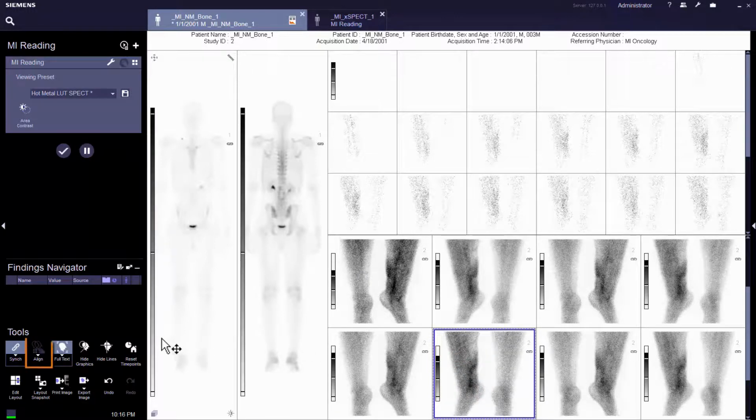The lock and scroll icons are used to adjust spatial alignment between two or more datasets. This icon will only be activated in the volume stripe display. If you believe the spatial alignment within a dataset is suboptimal, you can manipulate this by utilizing the Adjust Spatial Alignment icon.